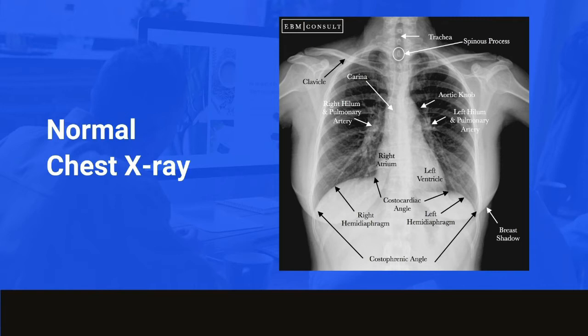To remember the things which are visible on the chest X-ray, there is a mnemonic comprising the alphabets from A to H. You can see the airway and apices of the lungs, bones, that is the rib cage and the clavicle, the sternum, cardiac shadow, diaphragm, edges of the lung fields, effusions, that is presence of fluid in the pleural cavity, foreign bodies, gastric bubble under the left dome of the diaphragm, great vessels, that is the aortic knuckle, and the hilum of the lung.